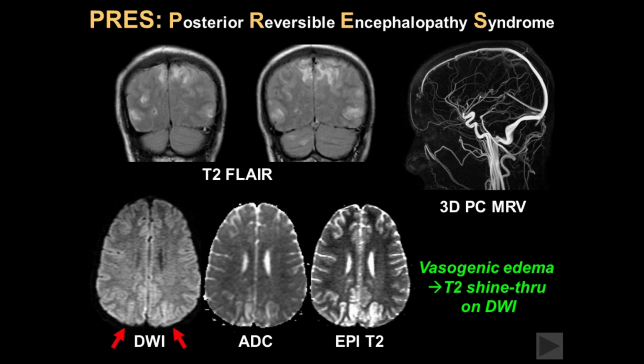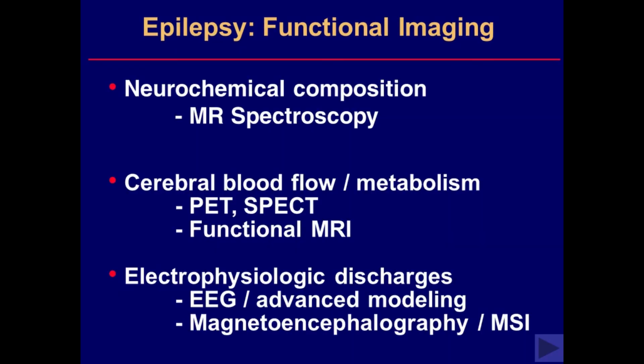And we'll want to exclude venous ischemia since we have complicated looking bilateral lesions here, but this is going to go away as soon as the inciting underlying condition is taken care of.